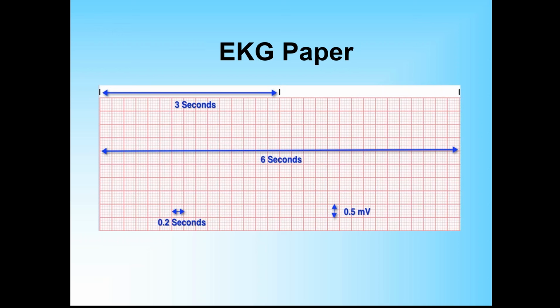More than that? That would be correct. 0.04, 0.2, yes. Okay. And be sure to look for hash marks on the rhythm strips. If you've got 3 of them there, you know you've got a 6-second strip. Okay. Thanks, Jessica. Next.